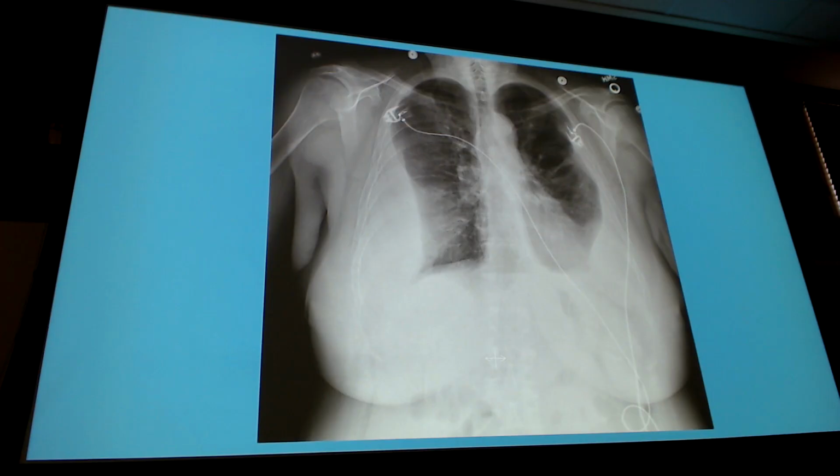All right. What do we got going on here? What did we talk about yesterday that was a subset of pleural effusions that you might think this could be? Loculated. Why do I think they're loculated? Because they don't start necessarily from the bottom and fill up with a meniscus sign. I got them kind of coming out from the edge here. How can I confirm that if I really wanted to? I would do a decubitus and see that the fluid doesn't change positions. Those are my loculated effusions.